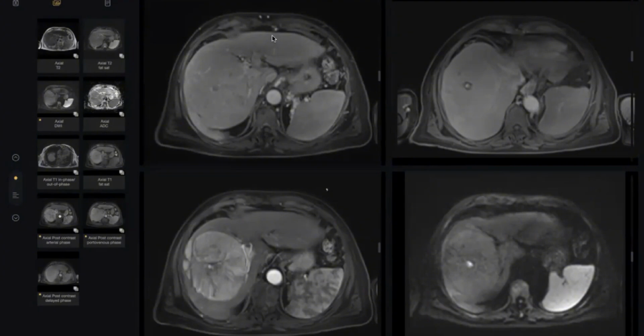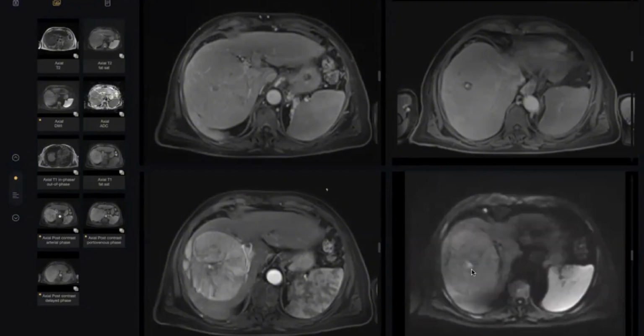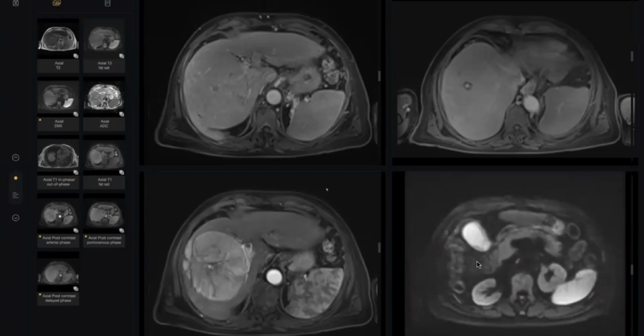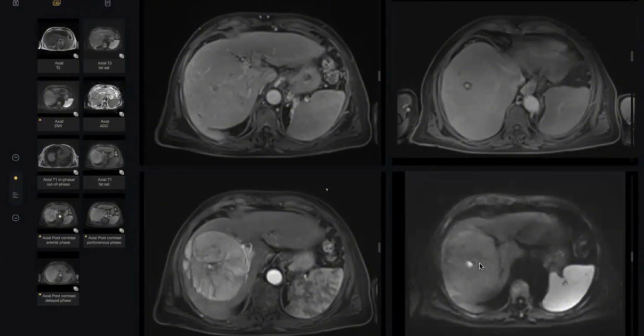The diffusion will not add up. It will not differentiate the hepatic lesions, the lesions are very small. What will you do next? I think there is no... What is your differential here? This is not tested, by the way. What's your differential?